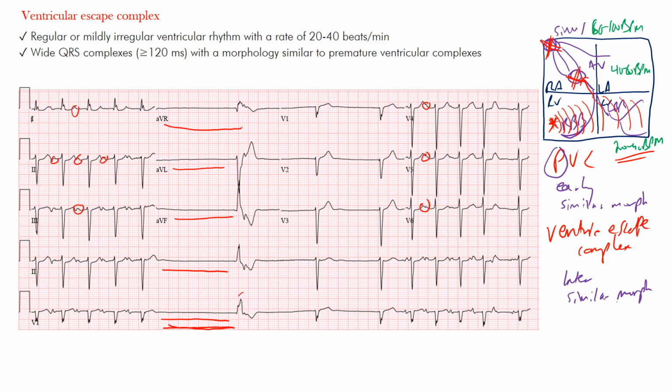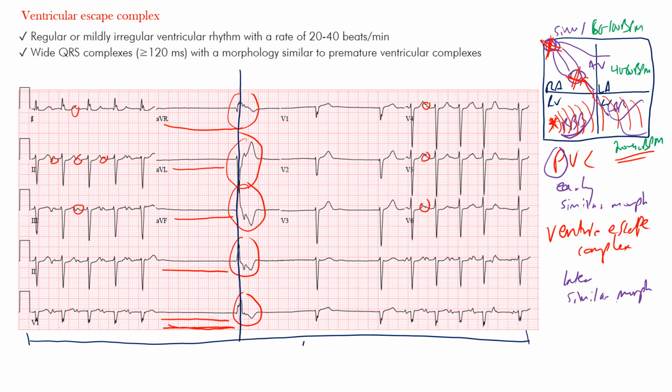There's only one complex here, okay? So remember, these are all happening at the same time because everything along this line is at the same time, because from beginning to end is how we have this. So left to right is our time domain, where you start from 0 seconds and you get to 10 seconds on this. So you can imagine this is maybe occurring around 4 seconds on our standard 12 lead EKG.